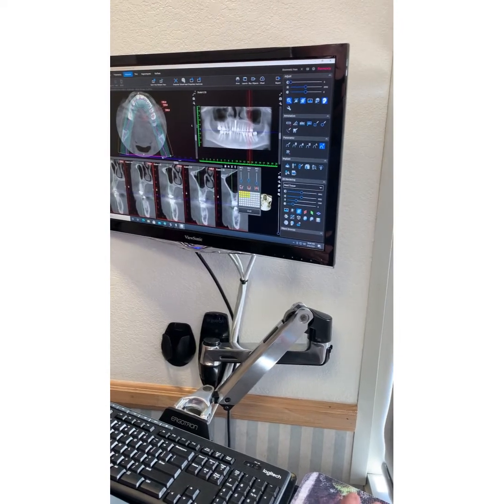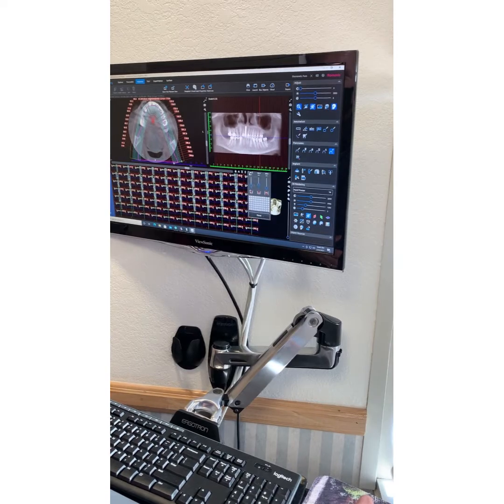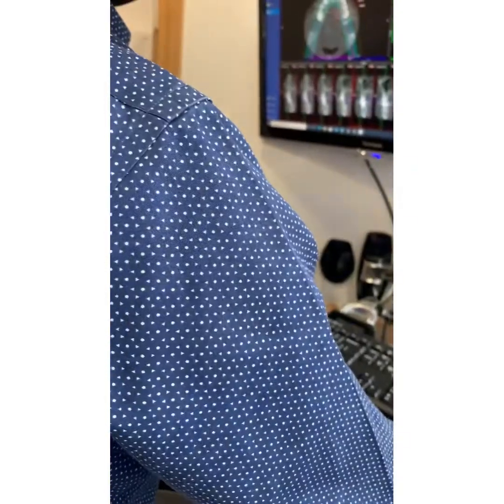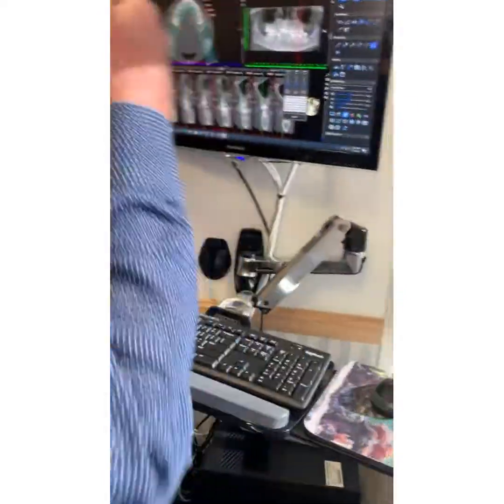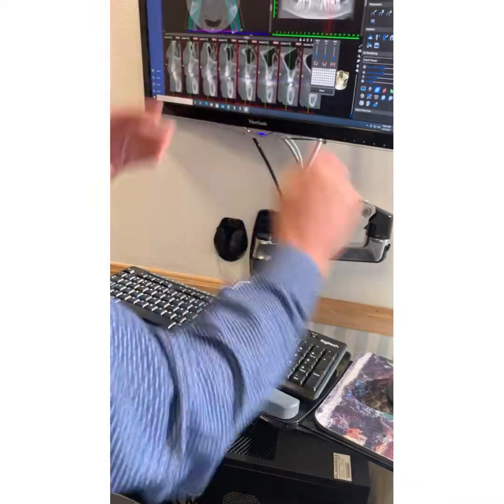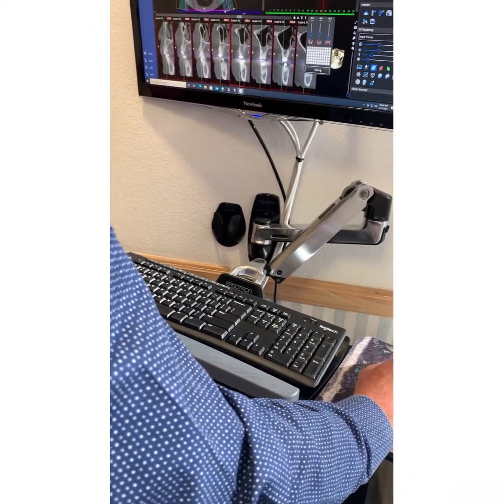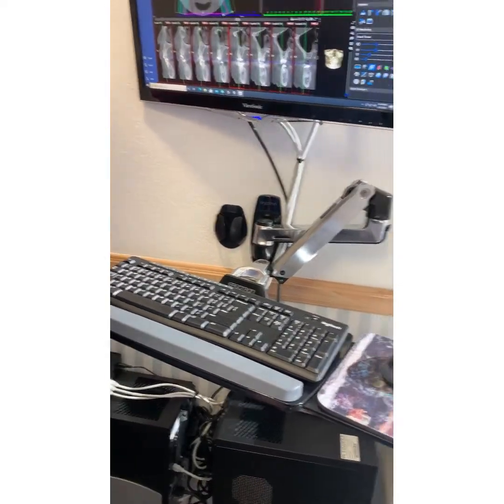I can take 7 or 8 postage stamps here. I usually go with like 8. Then I can go down a little bit. This changes the perspective you see from this direction. This just moves them closer or further apart from each other, and it's already super thin, 0.9, 0.3. So, yeah, very cool.